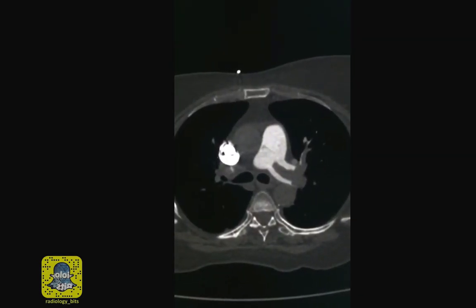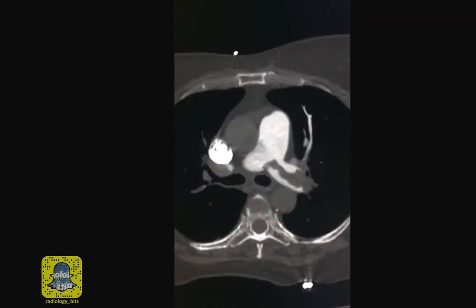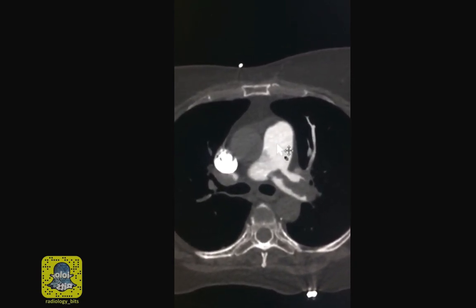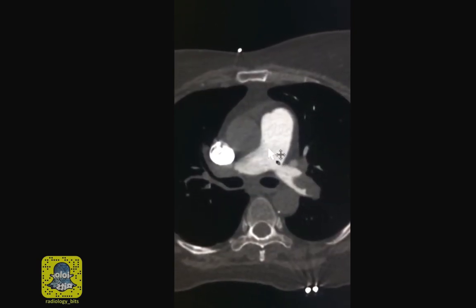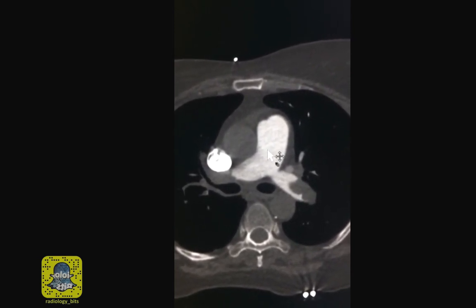This is bread and butter radiology, CT pulmonary angiogram performed to rule out embolism. The way the CT is performed is to give contrast and make sure that the concentration of contrast is maximum in the pulmonary artery. So the normal enhancing pulmonary artery is bright, as you see here. Anything that's dark within the pulmonary artery represents a filling defect.